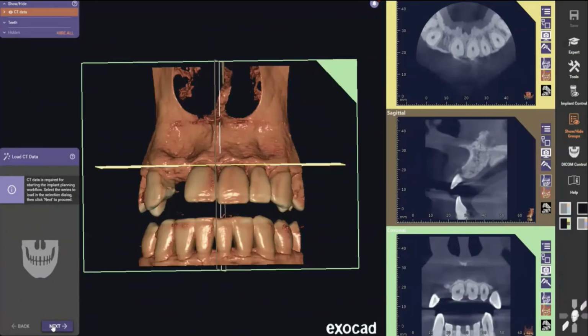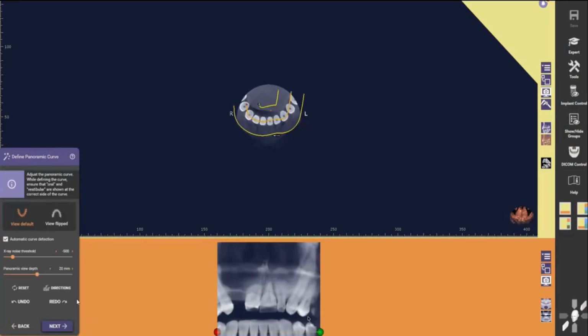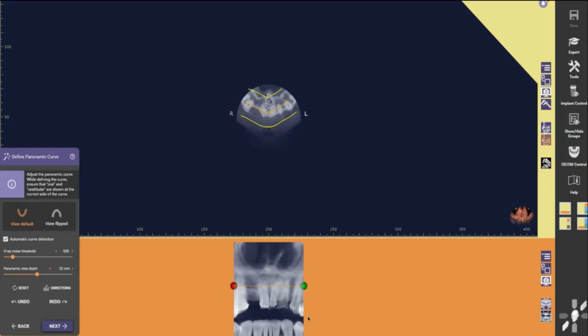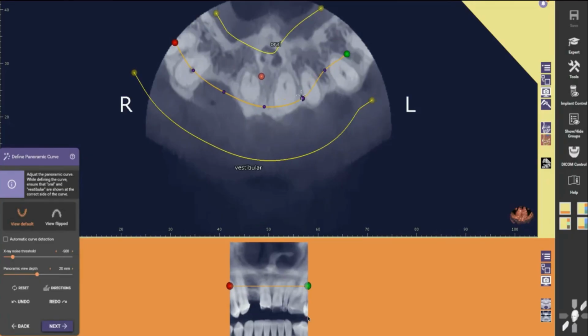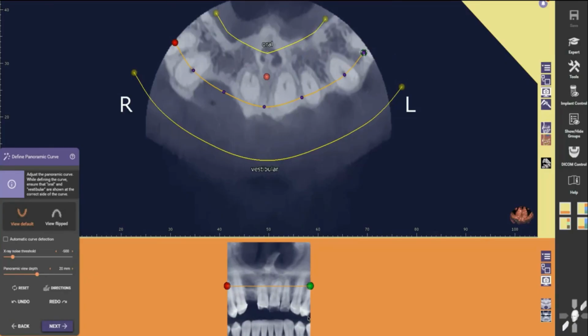So when we look at a case as we receive it, once the case comes in, we've digitized everything, right? We look at the DICOM, make sure it's usable. In some cases where the patients have a lot of restorations, there's a lot of metallic artifacts present. Sometimes we can't see the teeth. I've seen bad ones, but by and large, certainly locally, we've had a good experience.